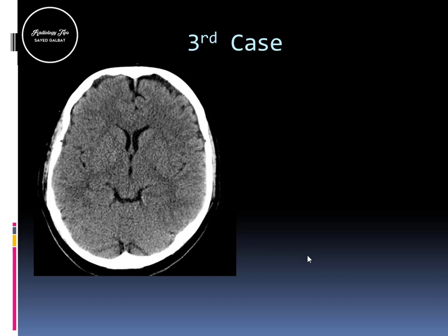The patient at that time refused treatment and just went home. As the symptoms persisted, the right hemiplegia, he came to your hospital, and then the neurologist asked for a CT to rule out infarction. So you did a non-contrast CT for this patient. Can anybody see any abnormality in this CT scan or not? Grossly.